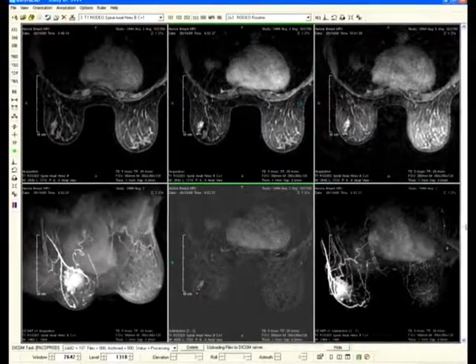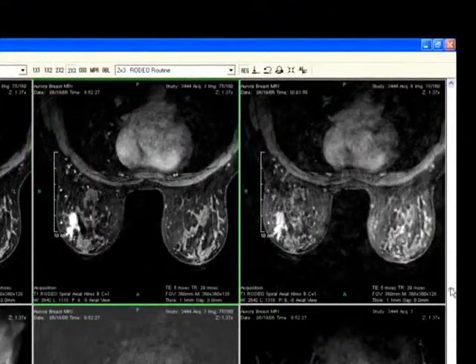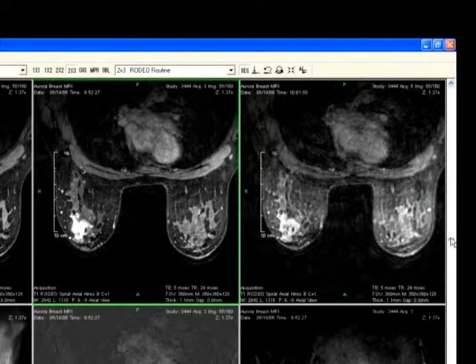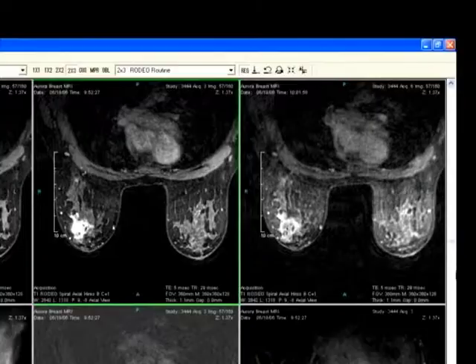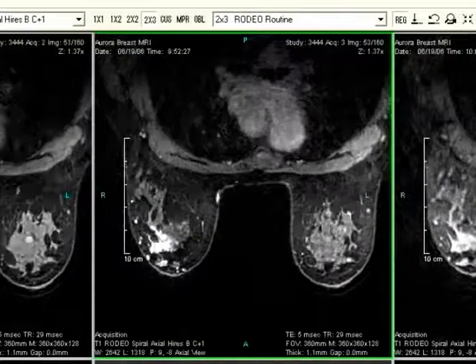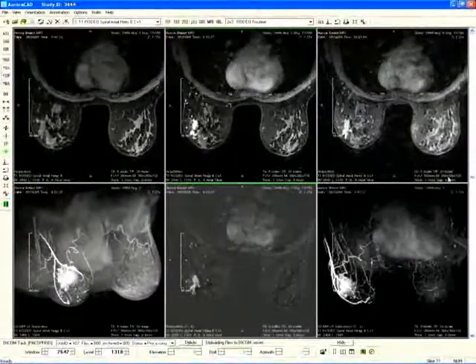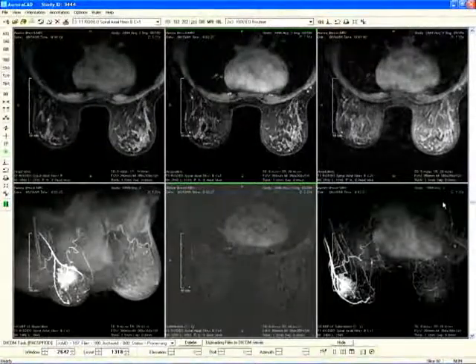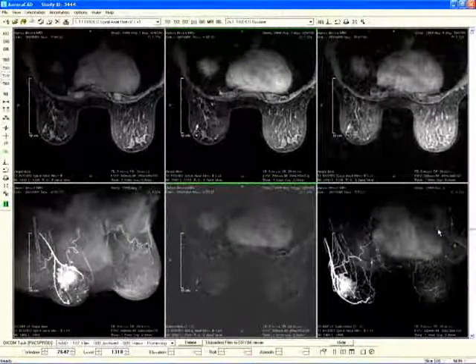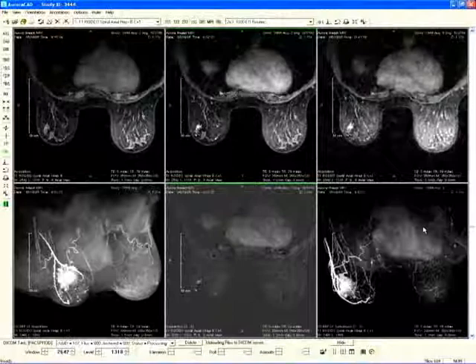When we compare the immediate and delayed post-contrast images, we see these lesions enhance very brightly on the immediate post-contrast images and appear to wash out on the delayed images on the right. We see a clip artifact. It's a black spot in the mass. The mass is spiculated. This would be typical of an infiltrating carcinoma. There are multiple satellite lesions. Inferior to the index mass in the lower right breast is an incidental enhancing lesion. This area needs further examination.